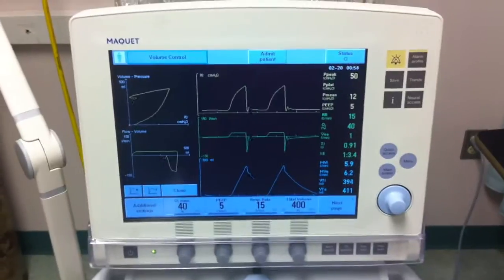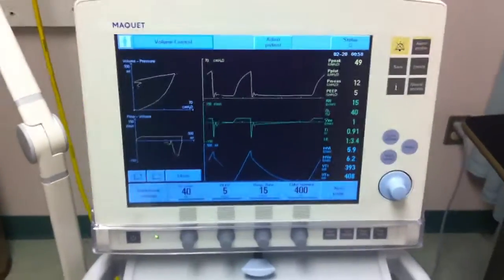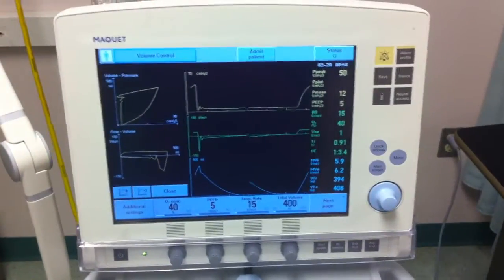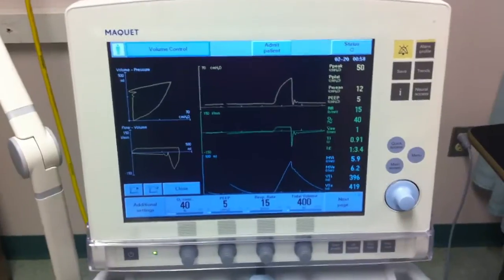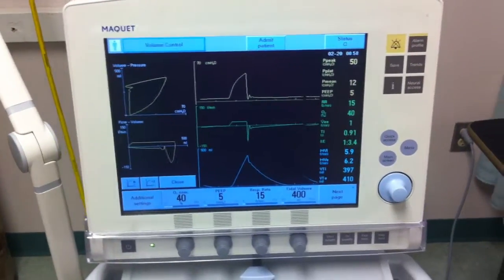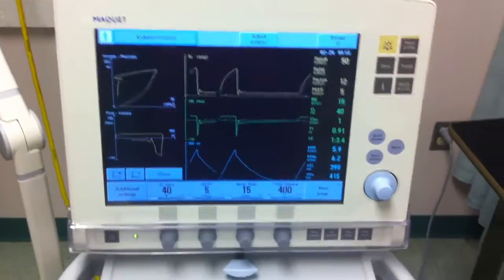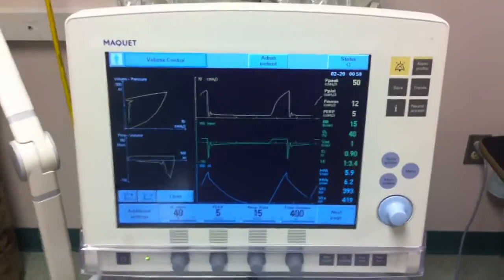Upon arrival, you attach the patient to your ventilator, and you notice the following graphics. This patient is intubated with an 8.0 endotracheal tube. The tidal volume you can assume to be appropriate for ideal body weight at this time. There is no other significant past or present medical history to be noted at this time.